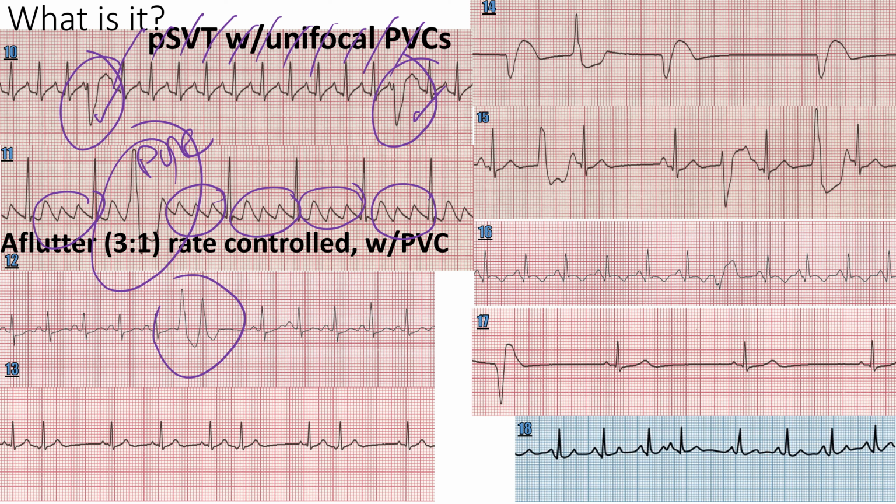Oh shoot, because how do I know they're PVCs? They're wide, irregular. There's also what's called a compensatory pause afterwards, which is extra credit, but you got 2 PVCs there and they look different in shape. That's not good. That's really set us up for VTAC.